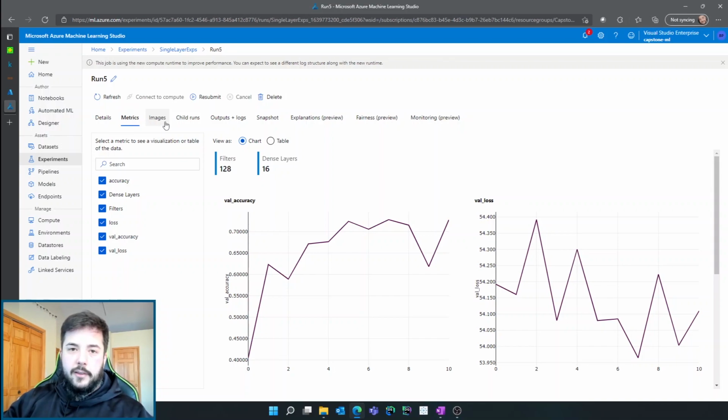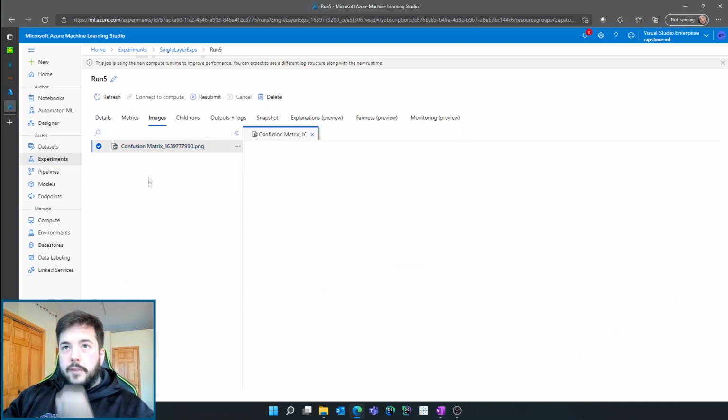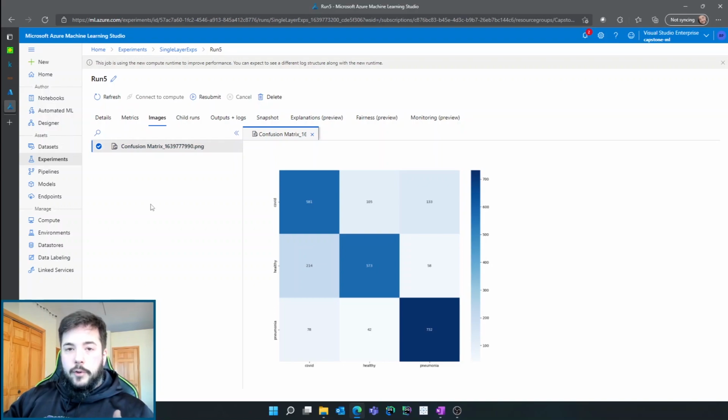So when I get to the section around how we did the pre-processing, test data is seen as, a lot of people call it held-out data, where in that case the model has not seen it yet. We run a test against that using our trained model, and we try to gauge its performance. What we can do is save those outputs, whether as an image or a metric or something, and actually log those, including images, back to the Azure ML experiment.